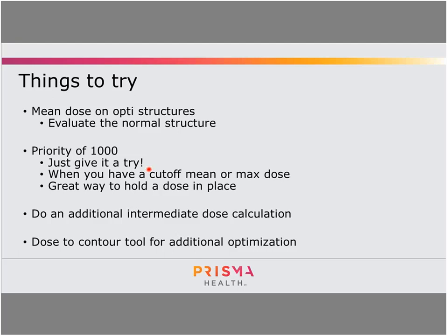When you go from intermediate dose calc back into the optimizer, you'll see just a very big discrepancy. Your targets aren't covered anymore. And this does happen in head and neck too when structures are sort of in air or sinus, like around the nasopharynx, just anything up there. And so additional dose calculations help get you closer to what you're optimizing. So I hope that made sense.